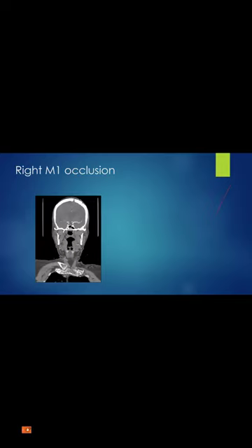Here, you see there is a right M1 occlusion. Again, this was missed by the resident because it's not a complete occlusion, it's a filling defect, not completely filling the artery. When you do the axial run, sometimes you may not be able to pick it up because of the tortuosity of the artery.